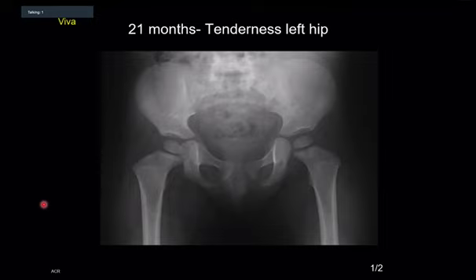I can't see any evidence of effusion in the left hip. So given this appearance of lucency in the metaphysis, I would be concerned about a possible infective cause such as a Brodie's abscess would be a possible differential. I would correlate with the patient's history to see if they have any fever or sepsis and proceed to MR.